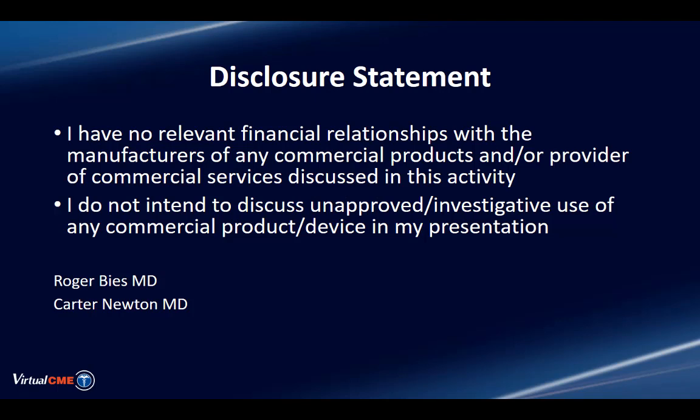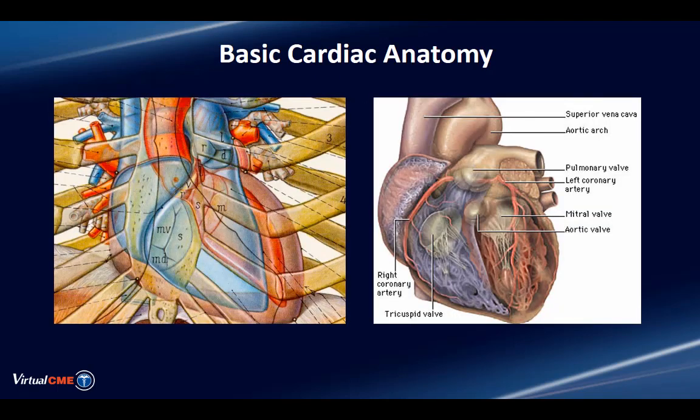Let's talk a little bit about cardiac anatomy via CTA, for example, and I'll bring up a few images here for general discussion. We all know that the skeleton, of course, is typically very symmetrical. However, with the cardiac structures, there's really nothing which is perpendicular to any of the typical orthogonal planes. Everything in the heart is rotated, everything is asymmetrical. It takes a certain familiarity with the cardiac structures to really know what we're looking at in different viewing angles.